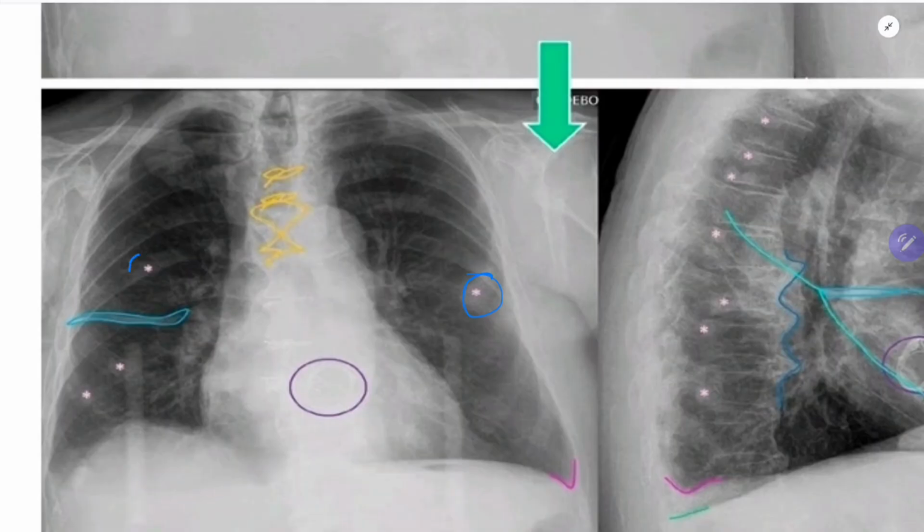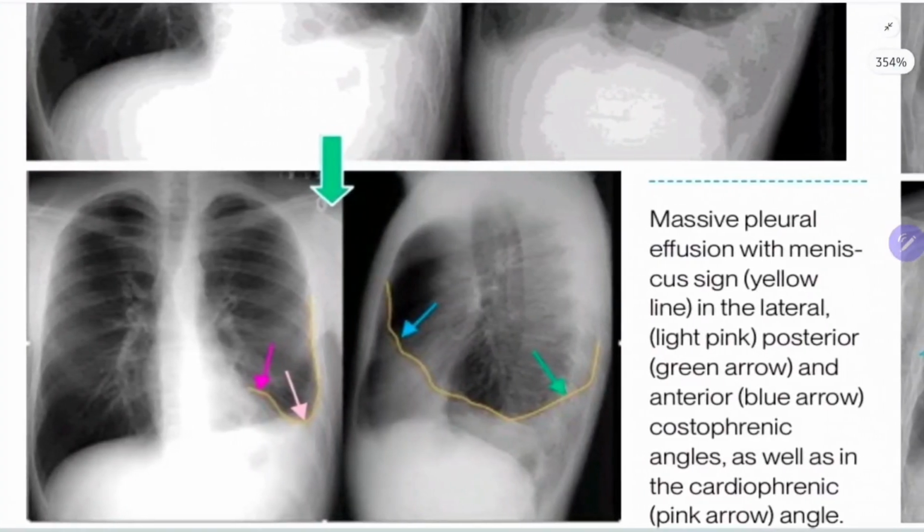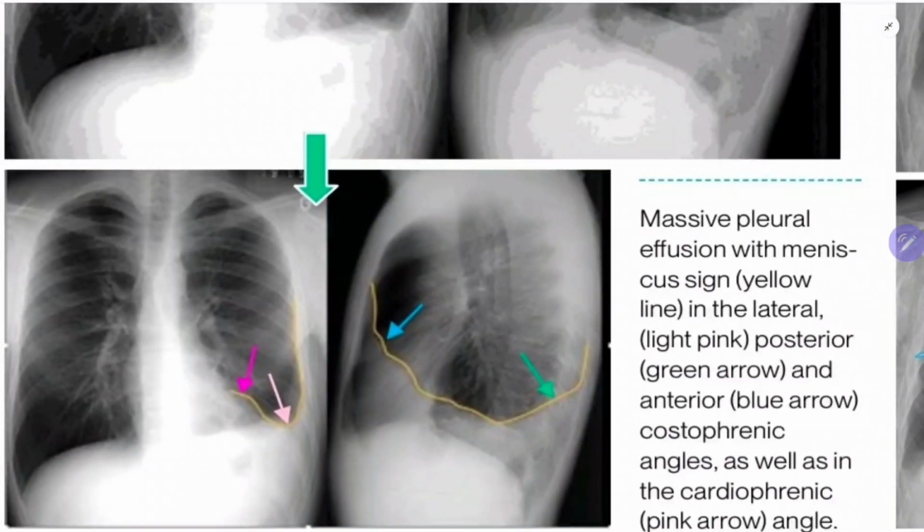These things we have missed. These things, nothing is prominent. Okay. So the gross things we have seen. Now we will see this one, the first one.